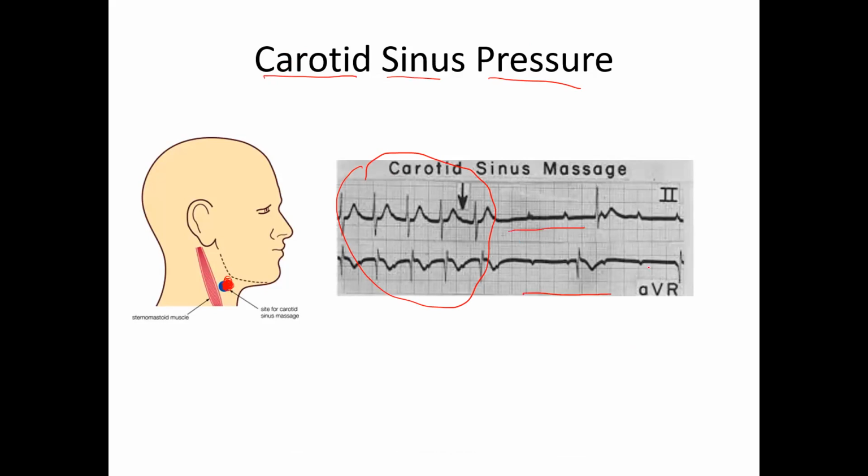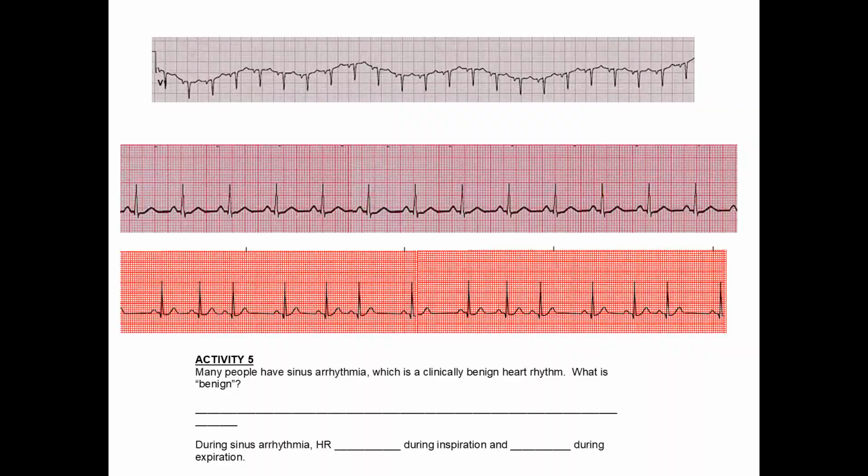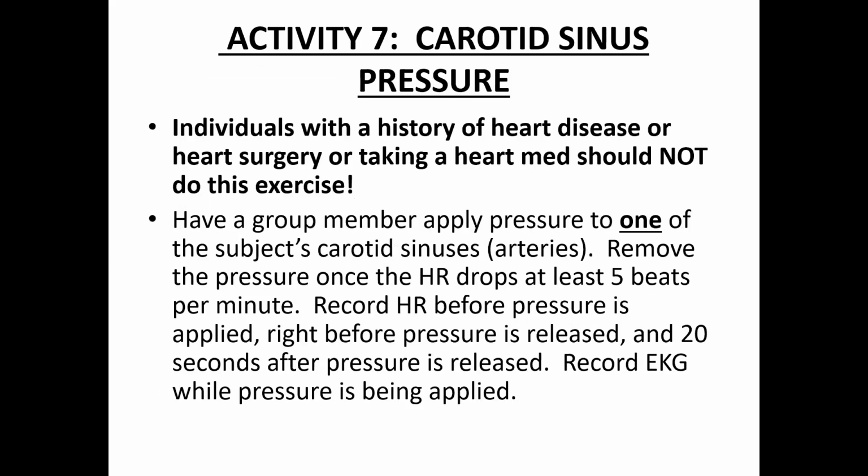So we can see if there's a P wave. This one's pretty difficult. This is lead 2. So there's some things going on here that are abnormal. So there's another one coming up, which is better. Let me take you to that one just so you can see. Right here's a good one.